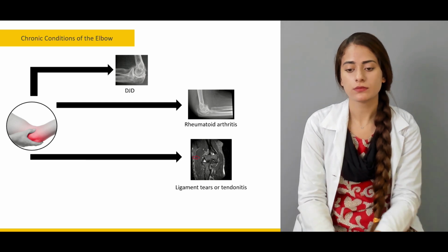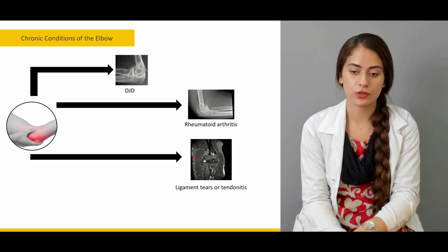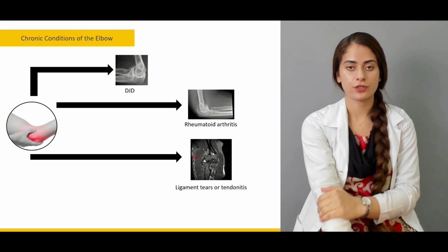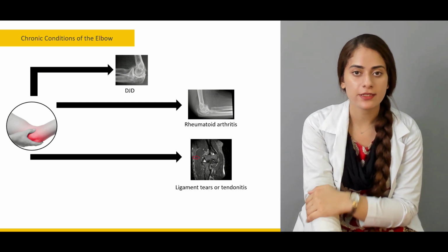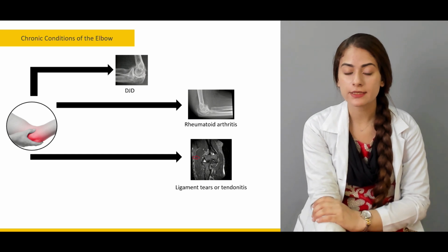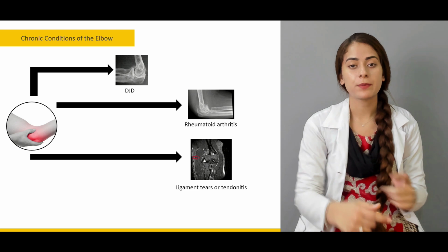So then we have ligament tears and tendonitis. First, let's establish the fact that all the flexor tendons are attached to the medial epicondyle.